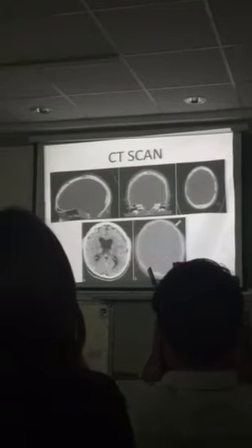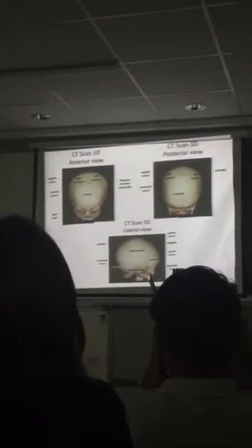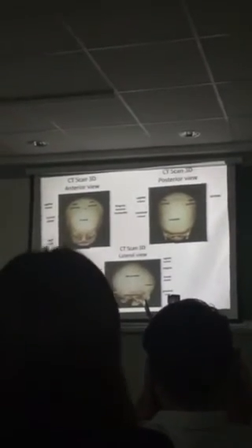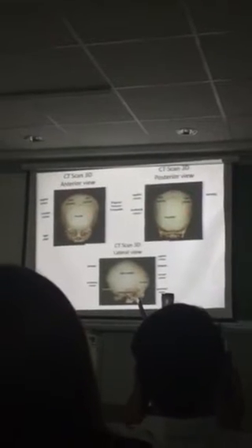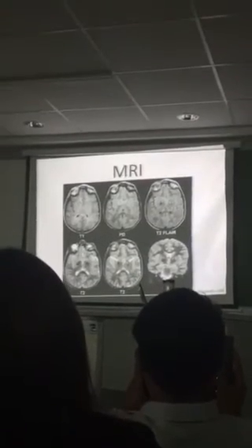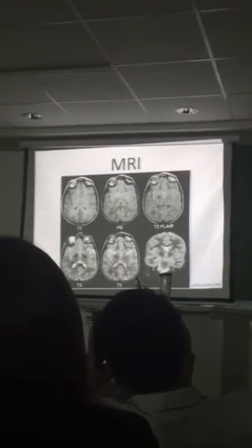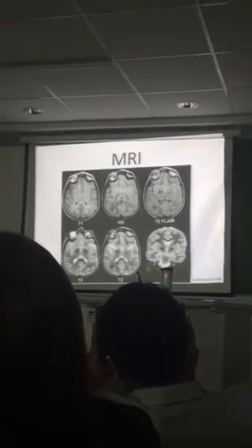What view? So this is the CT scan 3D of the skull. Like before, just review the different parts. The frontal, what I asked you earlier. Okay, MRI. You can distinguish whether it's MRI or CT. So when this is shown, you know it's MRI.